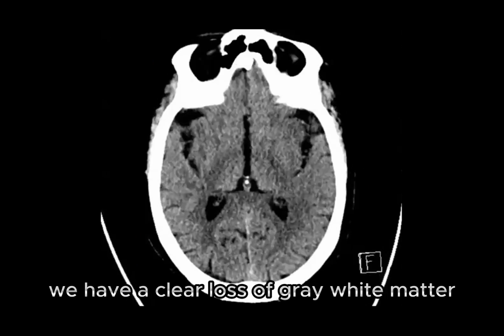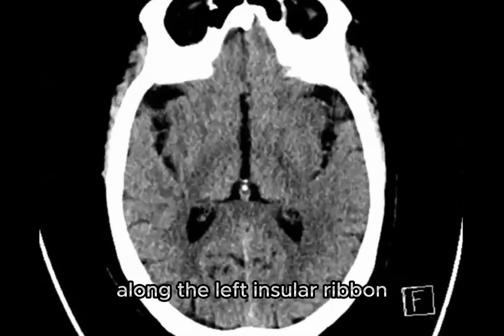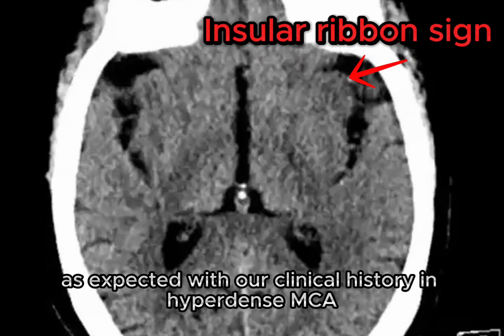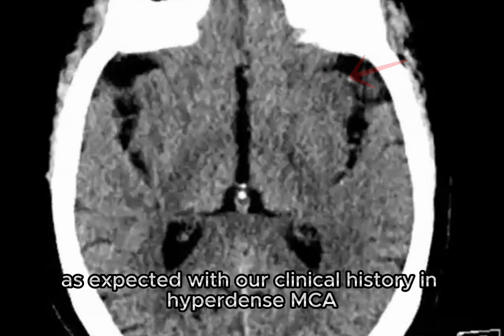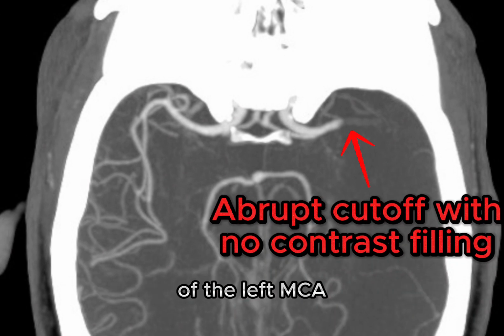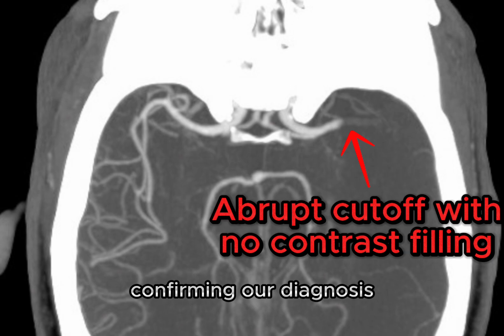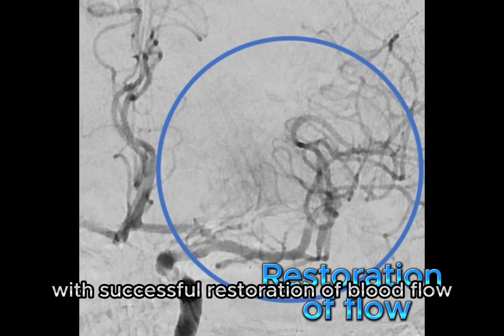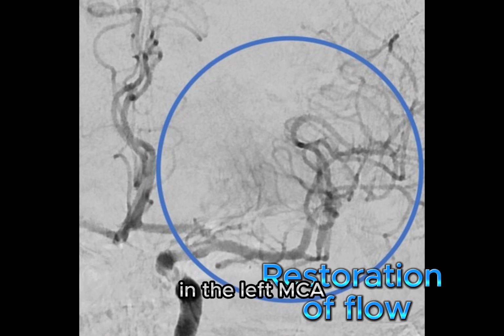We have a clear loss of gray-white matter along the left insular ribbon as early signs of ischemic stroke, as expected with our clinical history and hyperdense MCA. CT angiogram shows an abrupt cutoff of the left MCA, confirming our diagnosis. This patient went for thrombectomy with successful restoration of blood flow in the left MCA.